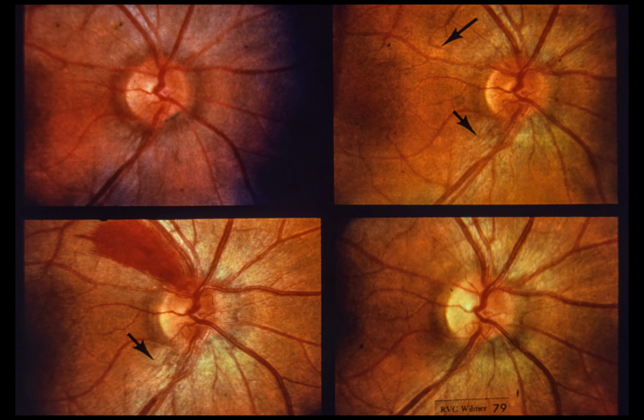1 month postoperatively, the patient noted a mild blur in his right eye. At this time, visual acuity was 20/20, with a slight diminution of color vision and a small cecocentral scotoma to red. Upper right. The right optic disc now shows mild hyperemia with blurring of the disc margin, particularly nasally. A short arrow points to a few telangiectatic vessels inferior to the disc. There is a small, flame-shaped hemorrhage, 1 disc diameter, temporal to the disc margin.